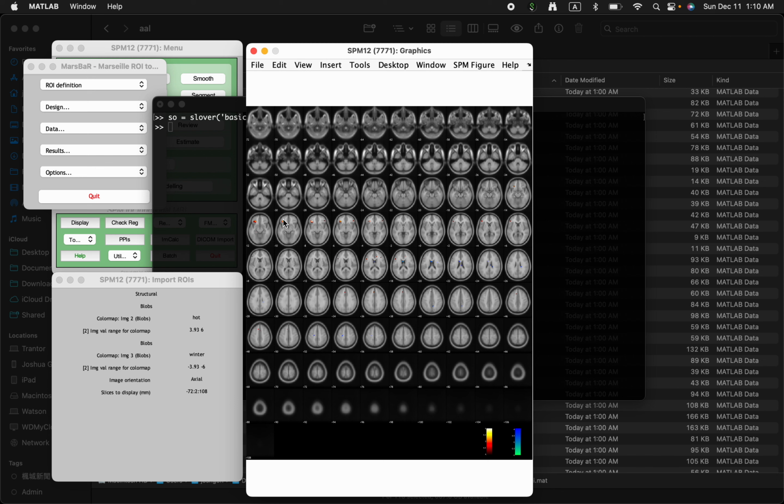You'll see the left IFG very clearly as a region that is warm and red because it's a positive effect. But if you notice, there might be some blue specks in the ventricles and around that area, which is in the scheme of the winter color because those are the negative voxels. Different contrasts might show you different positive and negative effects. In this case, this is what it looks like.